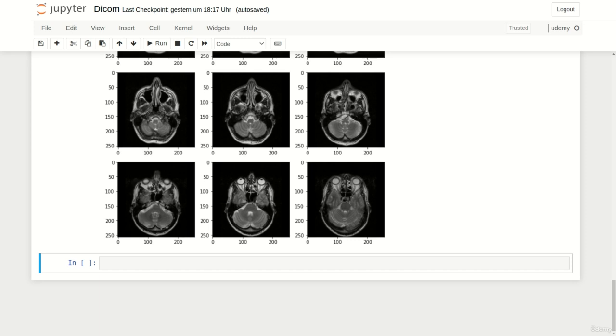Awesome! We now have a way to handle 2-dimensional and 3-dimensional data stored in the DICOM format. But as you will have noticed, manual file reading and ordering seems kind of tedious, and it would be great if there would exist a tool which handles this for us. And in fact, there is such a tool. Its name is SimpleITK.